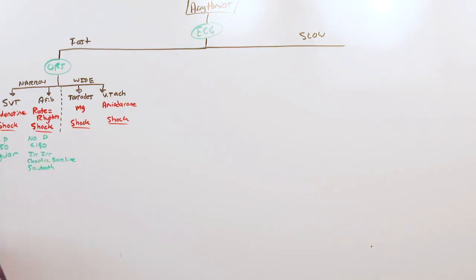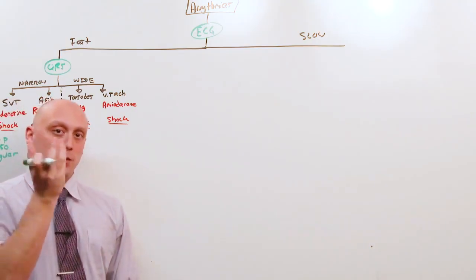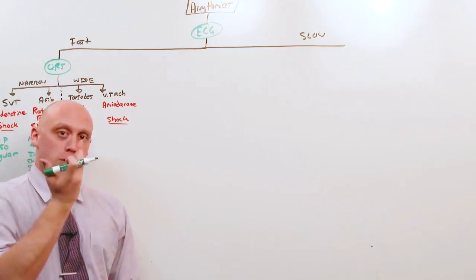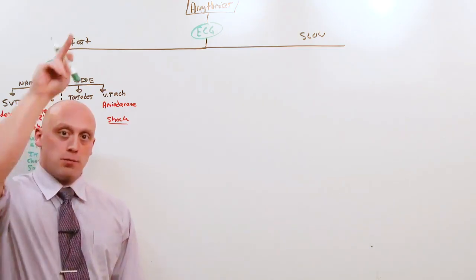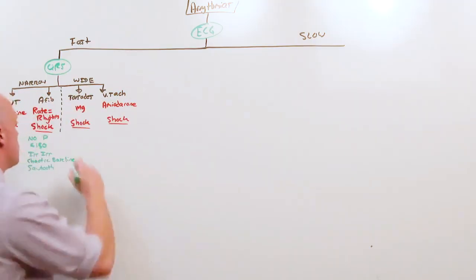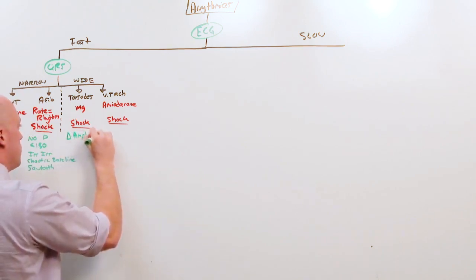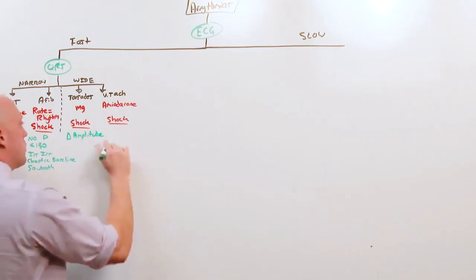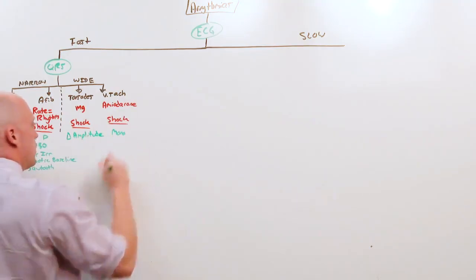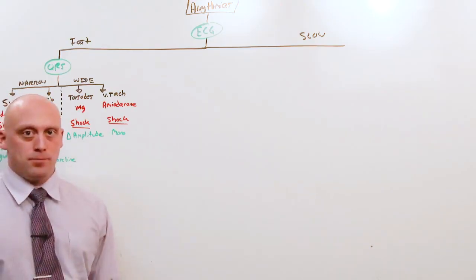For torsades, it's called torsade de pointes, turning of the points. Literally, the ectopic foci revolve around the heart, so you're going to see periods of getting bigger amplitude and smaller, bigger amplitude and smaller. It's pretty clear to see. This is changing amplitude. And the VTAC they're going to give you is going to be monomorphic. Monomorphic, wide complex, fast rhythm: VTAC.